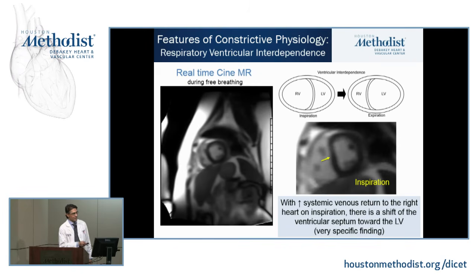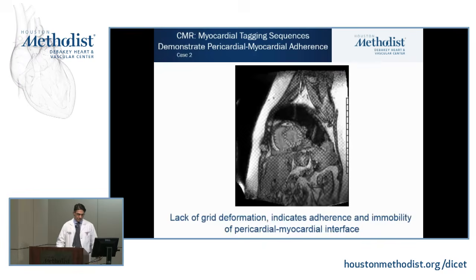And it's so subtle, I made an enlarged picture for you. And this, as Gopi had told you, is a very, very specific finding because it demonstrates ventricular uncoupling.